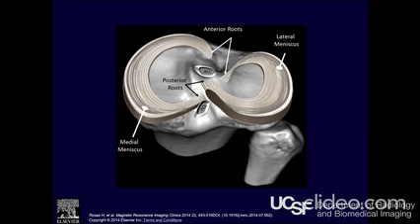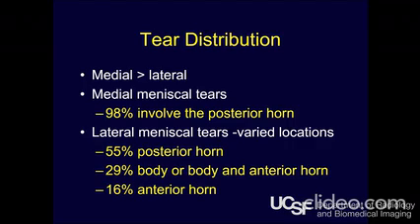And they show these fibrocartilaginous structures with a lot of fibers going longitudinal that provide hoop stresses to the meniscus. And you see medial and lateral menisci. It shows our cruciate ligaments and then the roots, anteriorly and posterior, lateral and the medial menisci. And the one thing I noticed that it doesn't really show is how the ACL gets very close to the anterior horn and root of the lateral meniscus, and the fibers intertwine. But it just really does a great job of showing our tears when we talk about them.